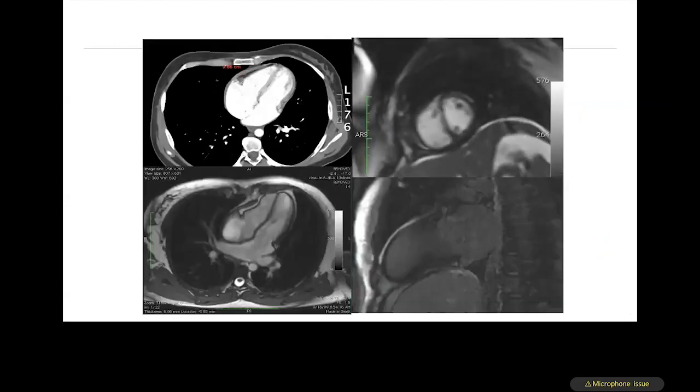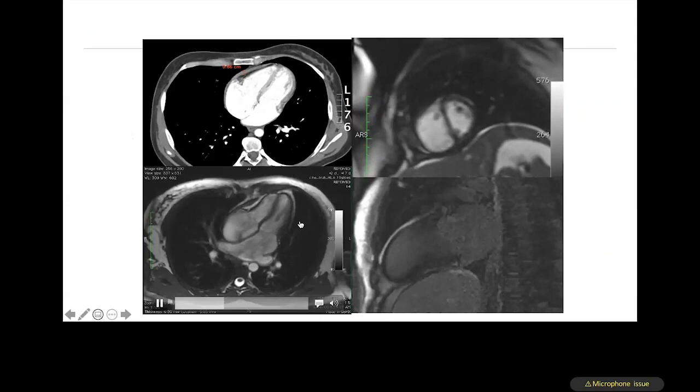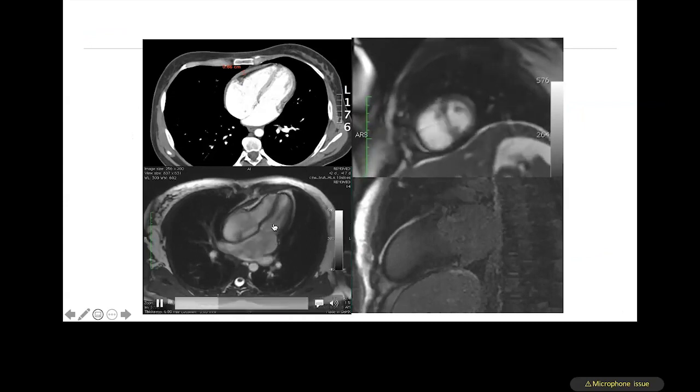Also, MRI techniques have developed that allow you to get information consistent with that obtained from echo. For example, the abnormal septal motion and the exaggerated interventricular interdependence can also be diagnosed using MRI techniques. You can see here in this particular patient with constrictive pericarditis a marked abnormal septal shift.